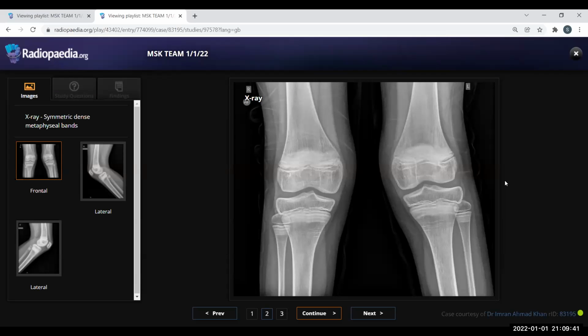Sorry. It's okay. It's okay. Go to the next case. Click next. It's fine. You are doing good.